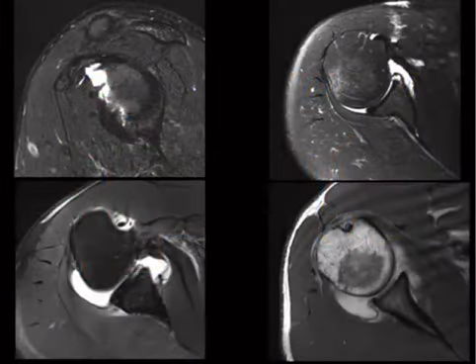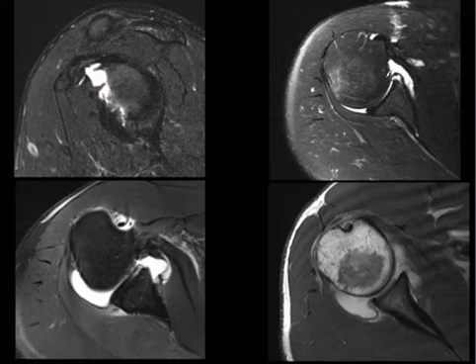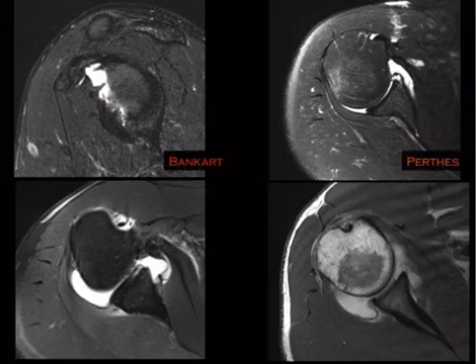Okay, rapid review time. This one, anterior, inferior. The bone is broken here. That's a Bankart, osseous Bankart. This one here, it's lifted off, but it's not scarred back. That's the Perthes, right? Here it's scarred back. All right, that's our ALPSA. And then this one here, just the cartilage is broken off. That's our GLAD.